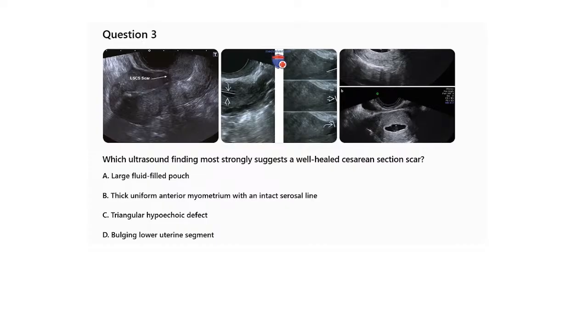Which ultrasound finding most strongly suggests a well-healed cesarean section scar?